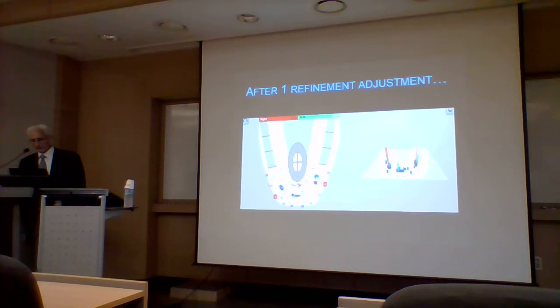And by adjusting that first grouping in the lower anterior region, the posterior implants now, after relieving this, became high force. And you see the implant warnings telling us to be wary of this.